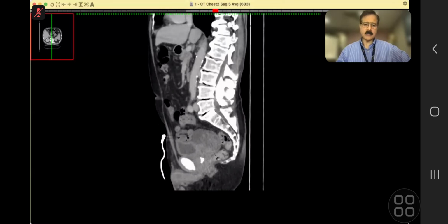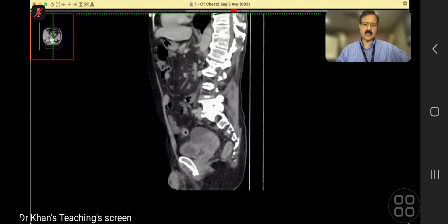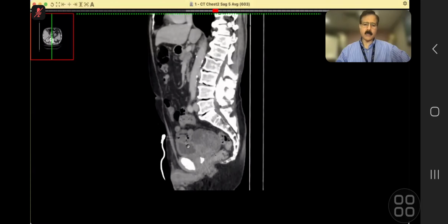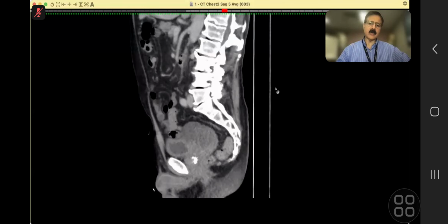So if you see the epicenter of prostate is here, and usually it will go here, though it can go behind also. You did very well where you picked up this thing, and I thought you will get it because you actually mentioned a breach of the wall or something, and this was one of the main findings, and I thought you have got it. But the same thing on MR.